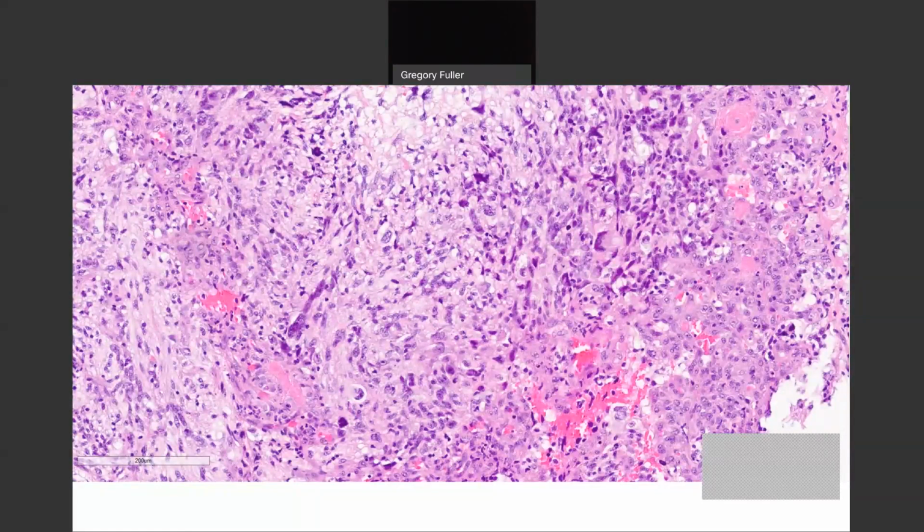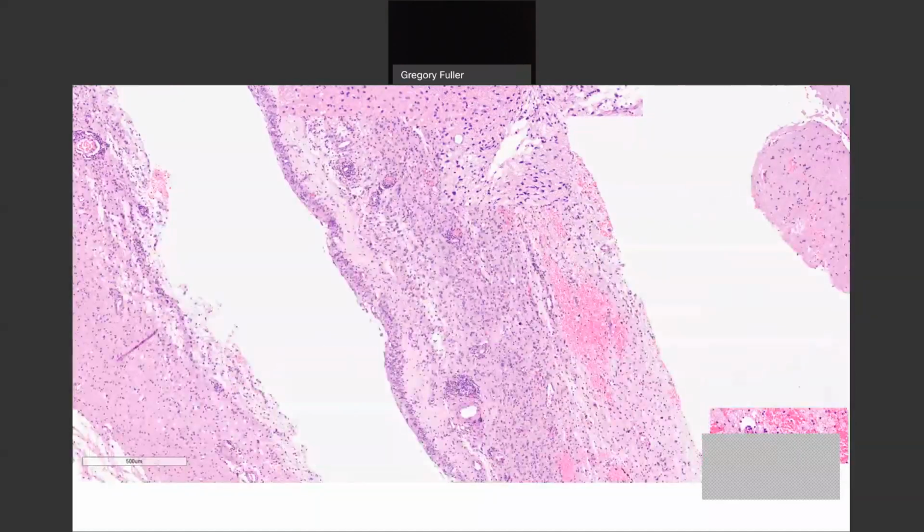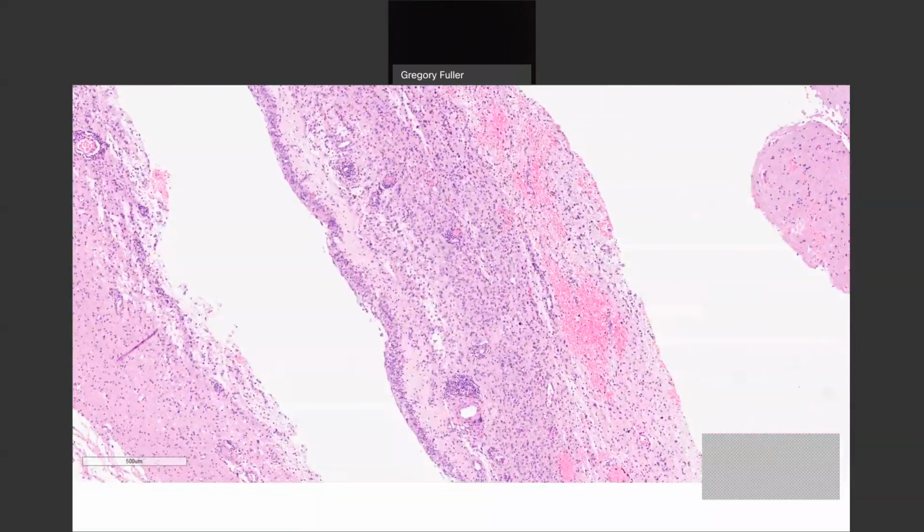I'm going to show you just two more H&E slides, kind of different. All right. These will be the last two. Here's the first one. Take that in for a second. Anything interesting? Here's the second. This is a different field. There's a big similarity between the two.